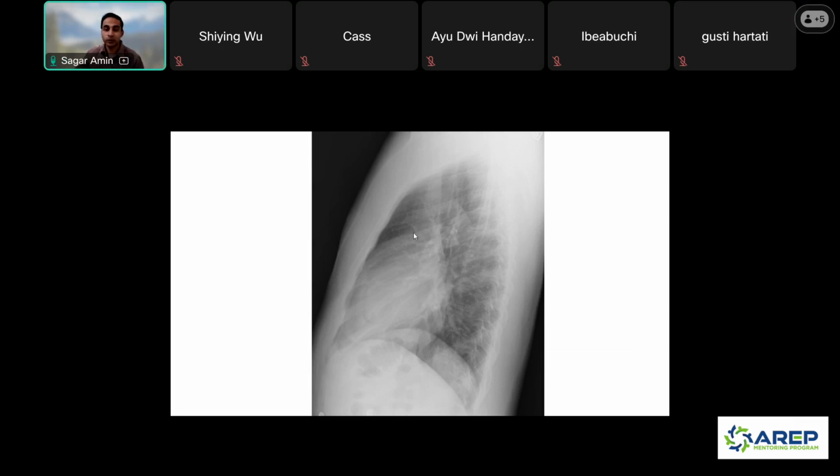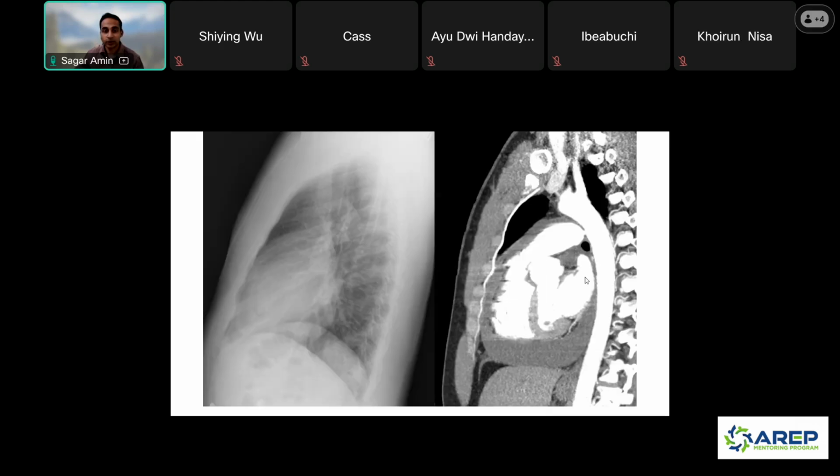All right, cool. So you can see that the cardiomediastinal silhouette is enlarged, and there's some soft tissue attenuation between the sternum and the heart. This is what you might see with a large pericardial effusion. If you look closely, there's a dark line where there's epicardial fat, and a little bit of a dark line around it. We often refer to this as the Oreo cookie sign, because the dark areas resemble the chocolate on the outer side of the cookie, and the inside is the filling. This is a good example of a large pericardial effusion on a lateral chest X-ray.